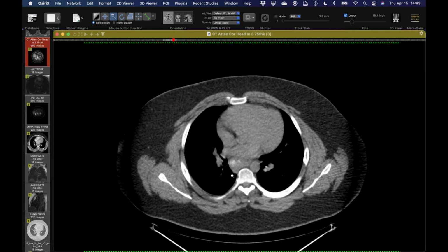And so this is a so-called flip-flop where the lymphadenitis is exuberant and disproportionate to the primary. Here's the axial PET images. You can see the uptake in that subcarinal node. It's not super hot, but there's definitely uptake in it. But we don't really see anything down in that right lower lobe. And so we see that a lot with granulomatous infection, particularly histo.